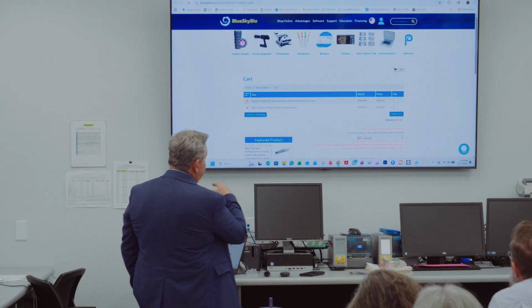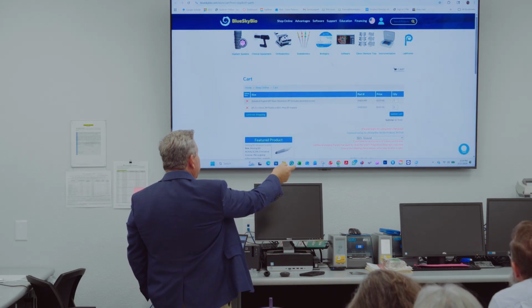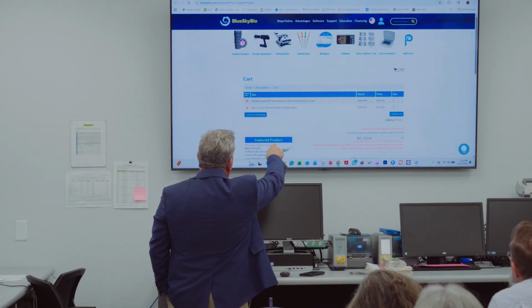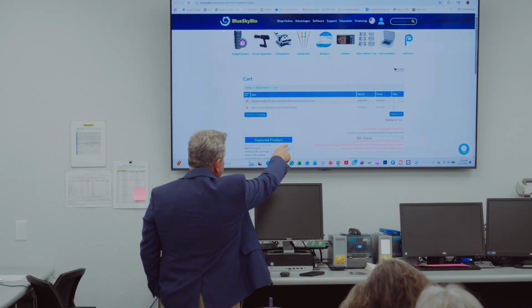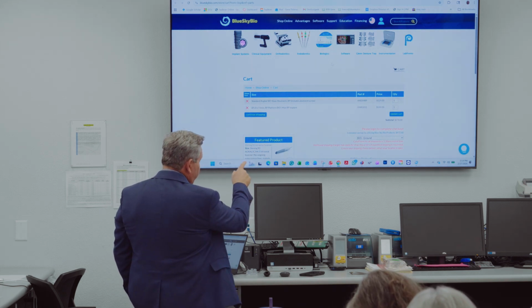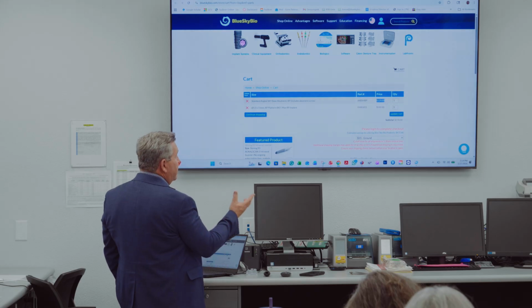Now it goes to the website, and it assumes that you already have a kit, because if not, it would say, buy a kit, because you're going to need to place the implant, since you chose our implant. Here it's going to put the implant in there, and the abutment. So the tie base and the crown, or the implant, it's going to be the total there plus $278. So you get a crown for free. If you buy the abutment, which you just paid $129 for here, you get the crown for free. So that's another hidden gem.